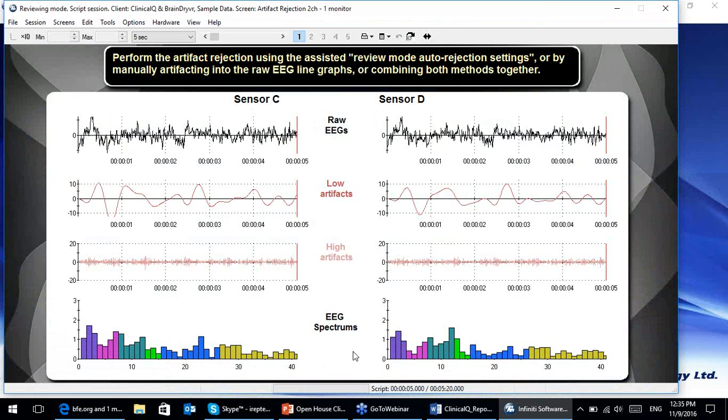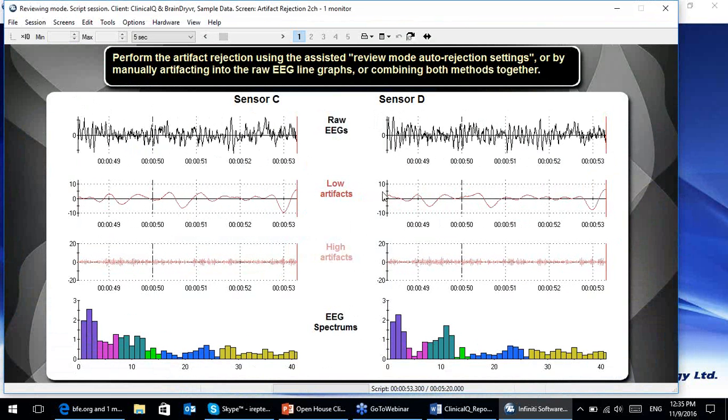It's much simpler. We used to have a lot of different numbers written here. Those numbers were not useful. They confused people. It was not good. So simple artifact rejection. Artifact rejection is done the same way as it's done before. I'm not going to describe that to you all because you either know it or you can get some online lesson from us that explain that. I'm going to go with this little printer icon to generate the new Excel report.